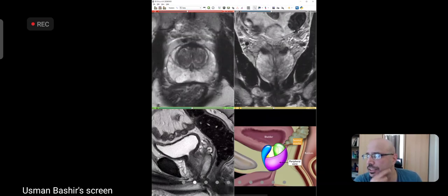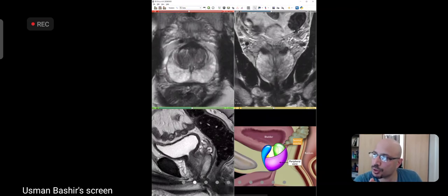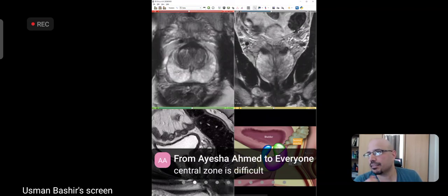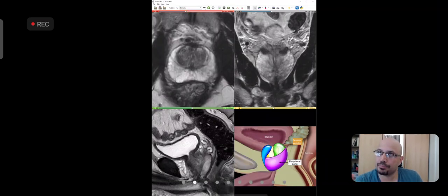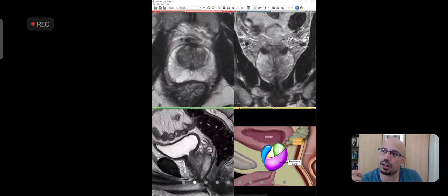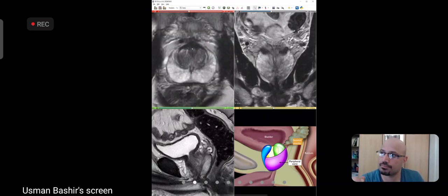Right, so I mentioned prostatic urethra, its relationship with the central zone. I've described the transitional zone. All of this white area, very nicely outlined around it, is the peripheral zone. And remember, 70% cancer in the peripheral zone, about 25% in the transitional zone. And this most darkest region at the anterior-most aspect of the prostate gland is the fibromuscular stroma. Look at it well, because you don't want to call this cancer. Okay, that's also a mistake.